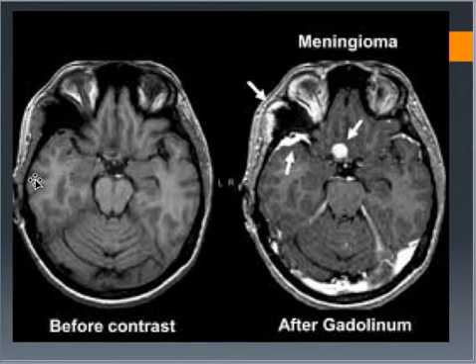So this is a meningioma. On this image over here, this is before we used contrast on the patient. So it's really hard to see anything that's going on. If you look, here's this meningioma. There's some issues going on over here and here. You can't really see any of them on this prior scan. A lot of patients can be misdiagnosed without the proper scan if they're not using contrast when they should, and so on and so forth.